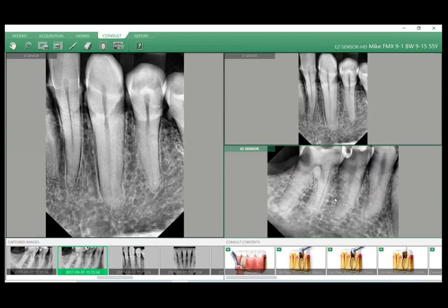In addition to that, we also have consult videos, which are down here on the right by default. So if I go over to my left side of my screen, you can see I have a recent list. I have my favorites I've set up here. So that's regarding the consult videos. We have all the specialties under the category section, which you can go through. I'll pull up perio, for example, and we have some scaling videos. So I actually have mine favorited here.